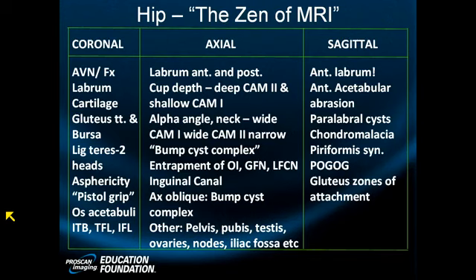I start out with the bilateral. Would you agree that the right hip is slightly undercovered by the acetabulum relative to the left hip? Doesn't quite go out to the drop-off. I think on the right side I should be able to sell you on that.